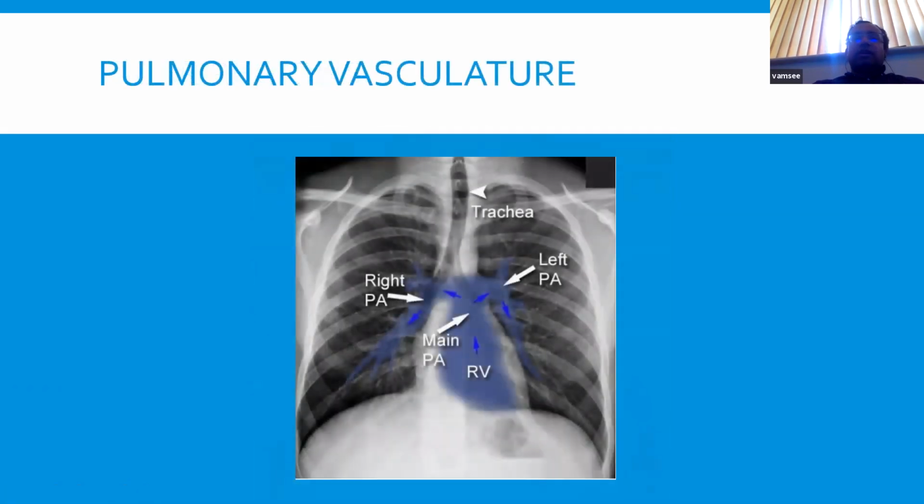So that's that. Now, with regards to the hilar region, we mentioned the pulmonary vasculature. This is probably the most prominent bit of that. You've got the pulmonary arteries coming off from the right ventricle, and that's what gives this spread on both sides, originating from the hilum. And that's what we can partially visualize, some of the big segmented branches of the pulmonary arteries on both sides.